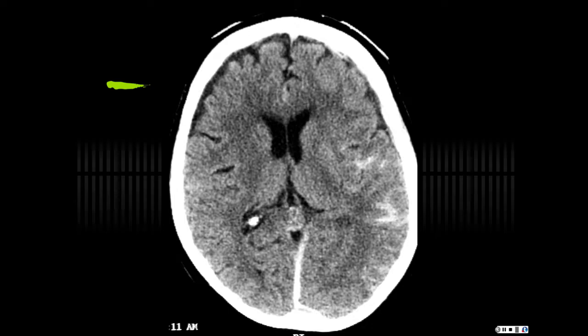This is a typical appearing subarachnoid hemorrhage where there's blood meandering through the cortical sulci. There's also some thickening of the falx back here. This looks, I think I may have taken this from the case earlier. This is a post-trauma case. There's some extraaxial blood here as well. Multi-compartmental blood is what until proven otherwise? Trauma.